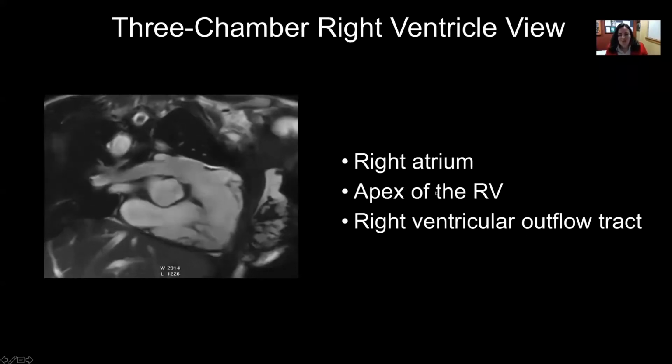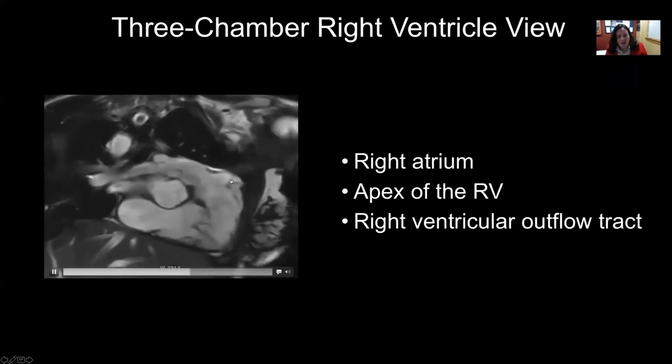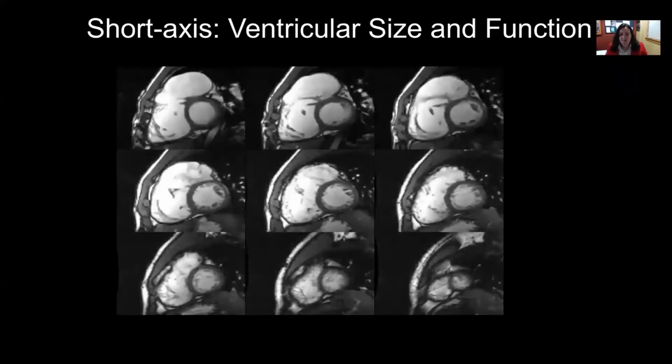I'd just like to share a few pictures with you. Here's a 3-chamber right ventricular view, as we call it. You can see in this Cine image, here's the right atrium, tricuspid valve, right ventricle here, and as you go out to the outflow, this person does not have much of a pulmonary valve present. You can see some dyskinesis here of the outflow tract as we go to the branch PAs. This is a nice view to start with, thinking about our patients with repaired tetralogy.